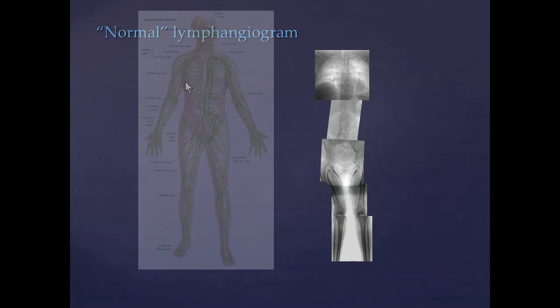But what I wanted to point out here, and it was in a very elegant cartoon that Dr. Roxon showed earlier, you really have a right and a left thoracic duct in a lot of people. And although typically there's a dominant left thoracic duct that goes up the spine on the left side and then plugs into the left subclavian vein, it's not uncommon to see branches going over to the right, or even a very mature looking thoracic duct. I've seen thoracic duct only on the right side, all the way up and plugging into the right subclavian vein.